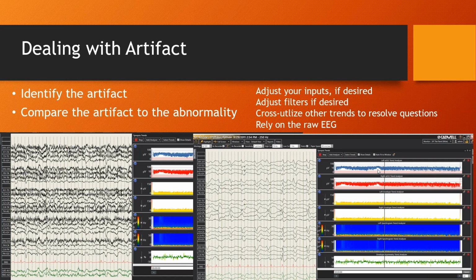But what we're seeing is this big peak in the amplitude integrated EEG that's kind of drawing us to the abnormality because there's a lot of muscle activity. So you're picking up an increase in the amplitude, whereas not so much when you're out here in the clean record. I would collect that as a registration point if I'm looking for abnormality.